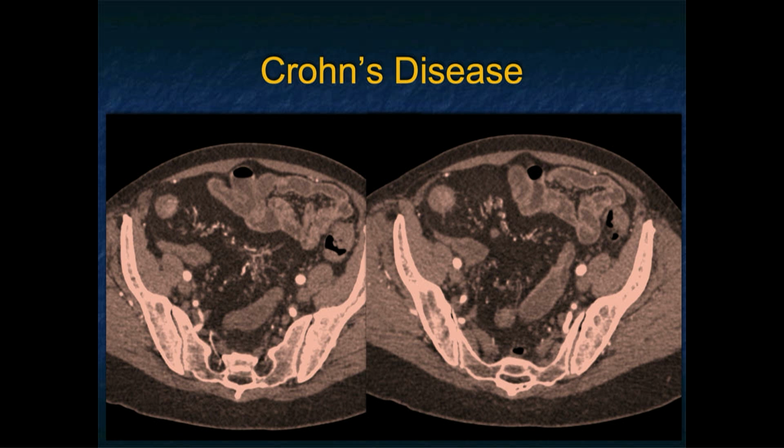Here's another example. One of the things you see in Crohn's disease is fatty proliferation of the mesentery. You can see that involving large bowel or small bowel. You can see the mass effect here, right? There's no abscess here. This was the things that used to be called on plain films a right lower quadrant abscess, but it's just fatty proliferation of the mesentery.